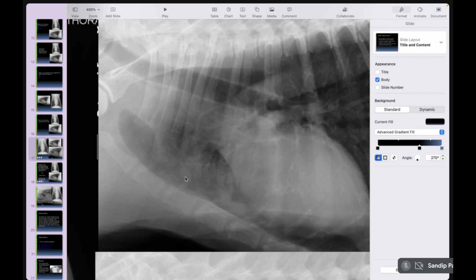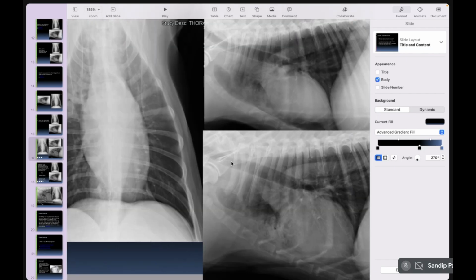Now down here it's getting more white. If we really see minutely, we have seen black branching extending towards the periphery. Normally, in normal vessel supply, it's a white branching going towards the periphery. But here we have seen black branching going towards the periphery.